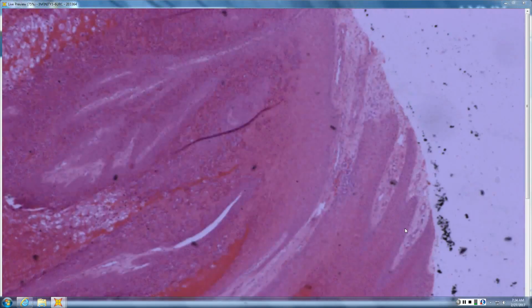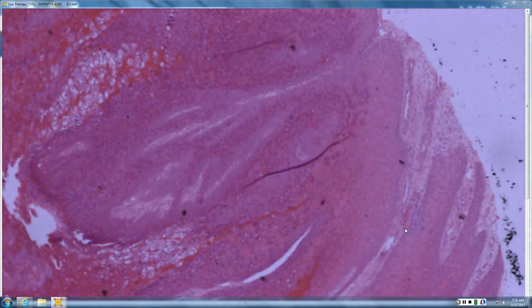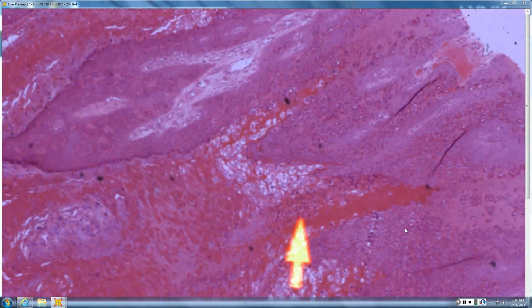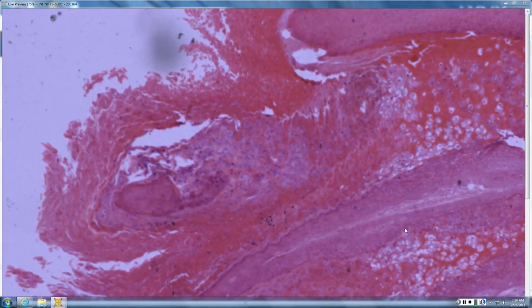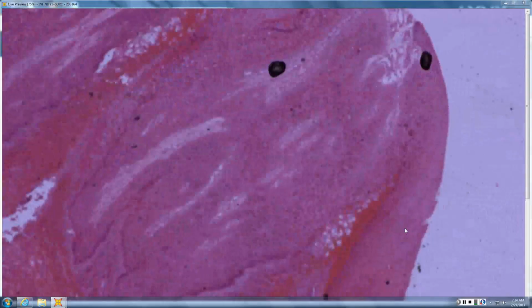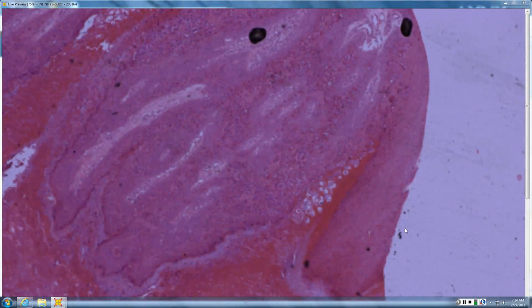Nicole, you want to start us out? Did you say me? I'm sorry. I did. Go ahead. So you've got papillomatosis and round parakeratosis. Church spires, I think I saw some hemorrhage in the horn as well. Yeah, very good. And then you've definitely got some sort of viral change. So there's granular cytoplasmic inclusions, and they look more red than purple to me from this power. And so we're probably on acral skin. So I'm thinking myrmecial. So myrmecial wart.